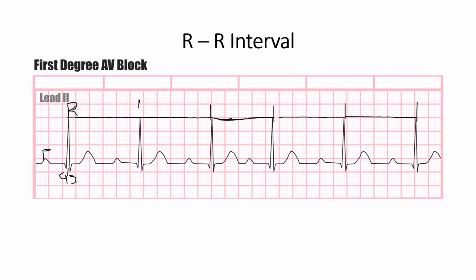Let's say this were missing. Let's say this was not here. If this were not here, you notice that from here all the way over here would be much longer than from, per se, here to here, right? It would just be longer. So that's what the point is.